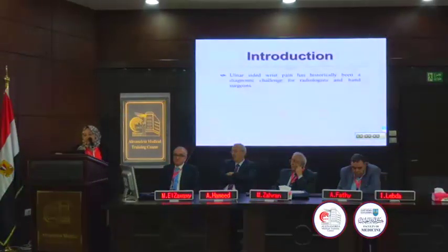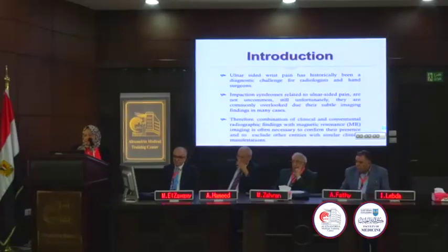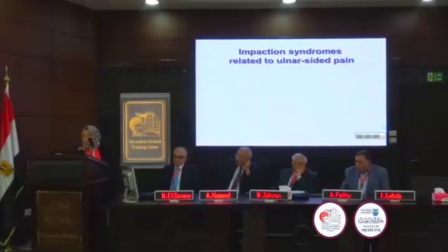Understanding ulnar-sided wrist pain has always been a diagnostic challenge for radiologists and hand surgeons, and impaction syndromes related to the ulnar side of the wrist are common. Still, unfortunately, they are commonly overlooked due to their subtle imaging findings in many cases, as we will see. Therefore, a combination of the clinical, conventional plain X-ray and MRI findings is often necessary to confirm the diagnosis and to exclude other entities with similar clinical presentation.